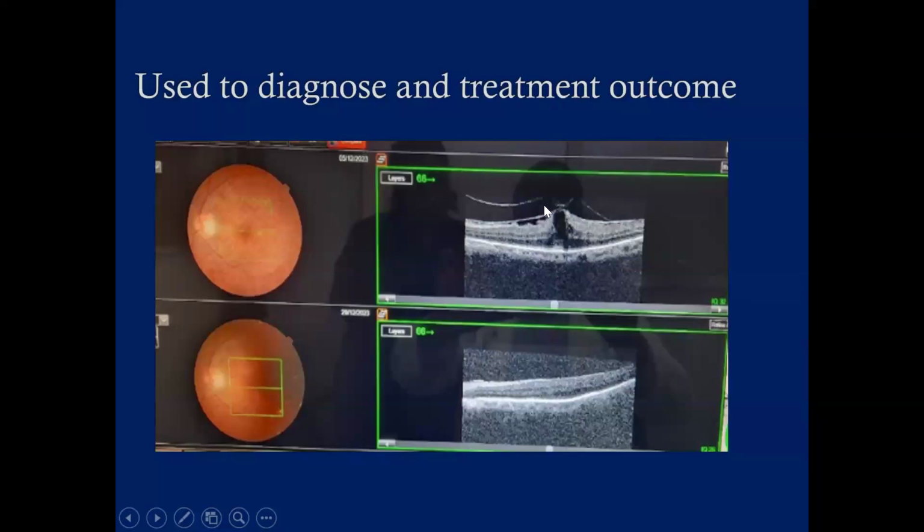This patient has vitreomacular traction with a preretinal membrane and a kind of subretinal fluid. After relieving this vitreomacular traction and removing the periretinal membrane, the patient has such a regular contour of the retina. The scanning was not good because the center was not well delineated, but I operated on this patient 2 months ago and the vision is good now.